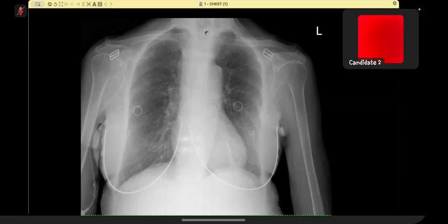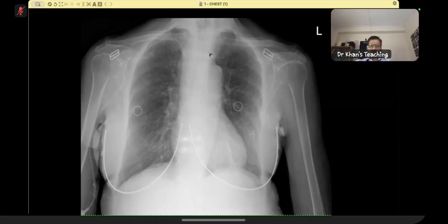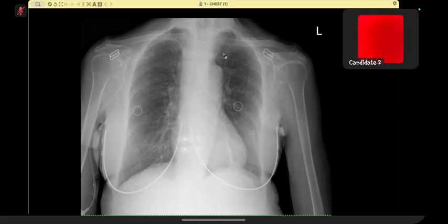This level here. This is the trachea, isn't it? Okay, so I was suspicious of this as a fluid level. But apart from this, I'm not able to see the gastric bubble, which makes me suspicious that this could be an achalasia, which in the presentation could be due to carcinoma causing a pseudoachalasia kind of a picture.